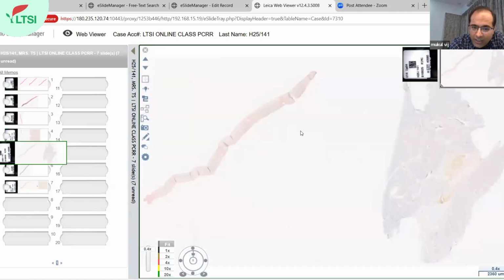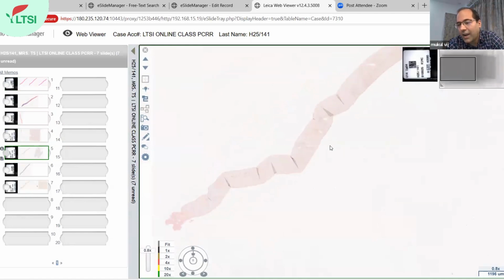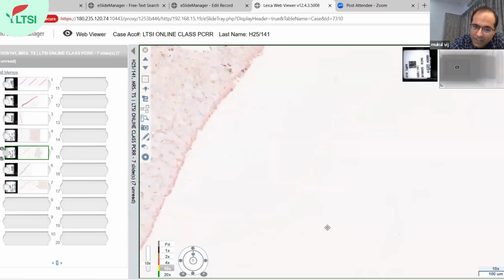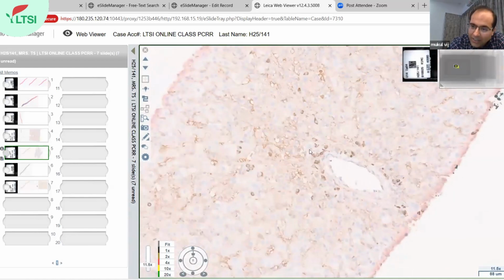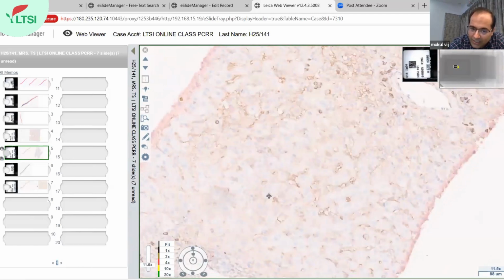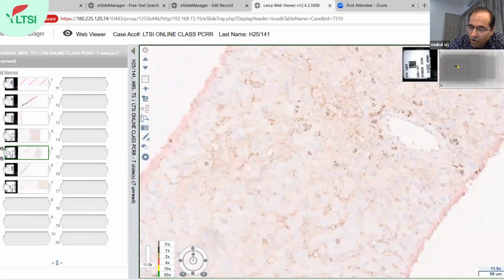Just to confirm, in this biopsy, IgG4 is a biomarker in an allograft biopsy. It should not be confused with autoimmune hepatitis or a native liver. In allograft biopsy, in cases of plasma cell rejection, you can see a lot of IgG4 cells. This is a biomarker which you can see in 60% of the cases. You can see all these brownish cells. This immunostain is done, and you can see these clusters of IgG4 plasma cells in the portal area as well as in the centrilobular area.